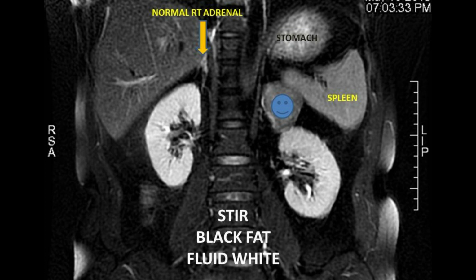And now we'll go to the enhancement pattern similar to that of the liver. It indicates mild to moderate enhancement. You can compare the spleen and the liver. Here the liver looks mild to moderate enhancement. In our case, the enhancement of the left suprarenal mass is less than that of the liver. So that's why the left adrenal gland shows only mild heterogeneous enhancement.